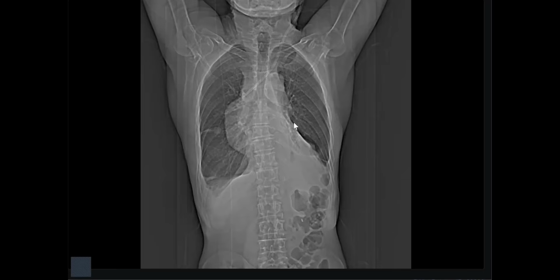Sir, this could represent a mediastinal hematoma as well, from damage to some of the vessels in the anterior mediastinum. So I would suggest further evaluation with a contrast enhanced CT scan chest. Very good start. You localize it as anterior mediastinal, okay?